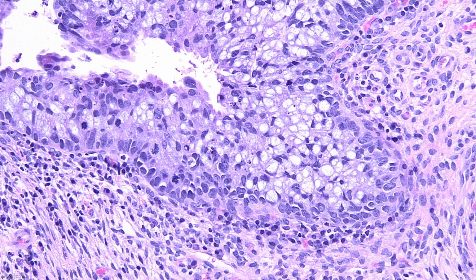This is an example of a special kind of glandular in situ lesion known as stratified mucin-producing intraepithelial lesion, which I think does a very nice job of describing itself in the name. It's also known as SMILE. You can see there are multiple floating mitotic figures and all the apoptotic debris as well.